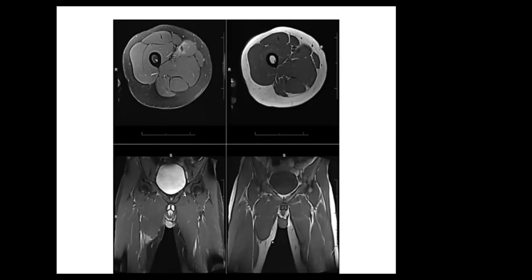It can be a denervation injury. Also, there is some focal atrophy of the muscle. History of gaming, I think. Yeah, soccer, yes, football. It can be some sort of injury.